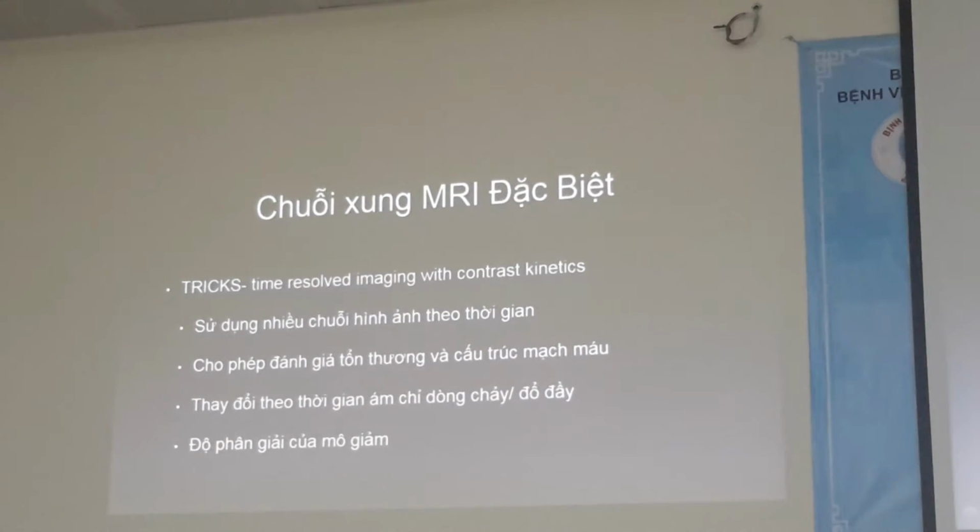And just like the diffusion weighted imaging that I showed you before, the tissue resolution is not going to be very good on this type of TRICS imaging because the goal is more to look at the dynamic changes over time.